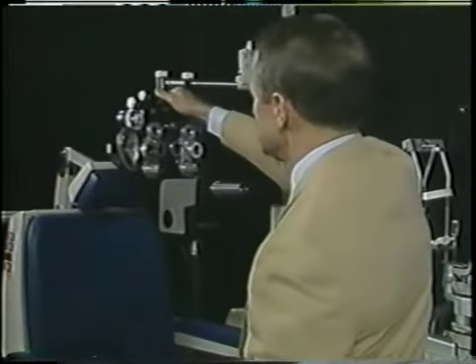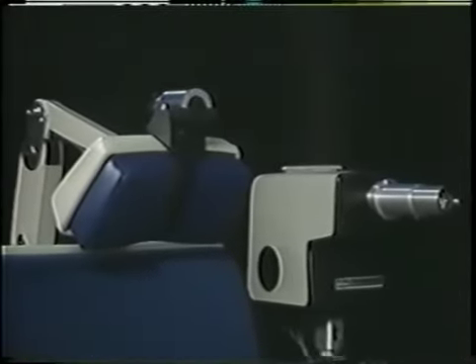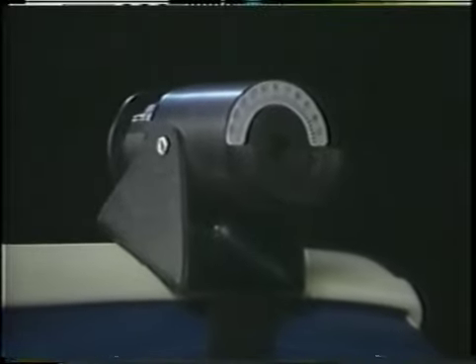The easiest way to learn retinoscopy is to use a refractor or phoropter with a so-called schematic eye mounted behind. For example, this schematic eye from the Burnell Corporation is easily positioned and taped on the examining chair, keeping it pointed straight ahead. The spherical refractive error, that is, the amount of nearsightedness or farsightedness, myopia or hyperopia, can be adjusted by moving this back portion in or out according to a scale marked on the device.